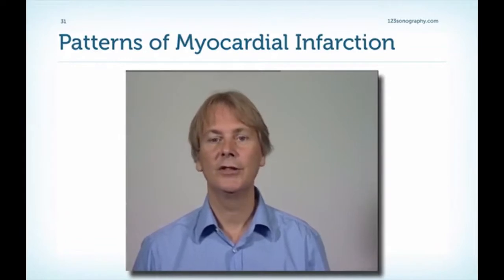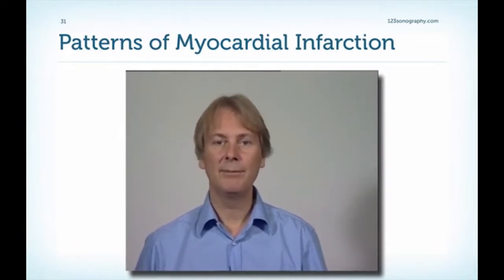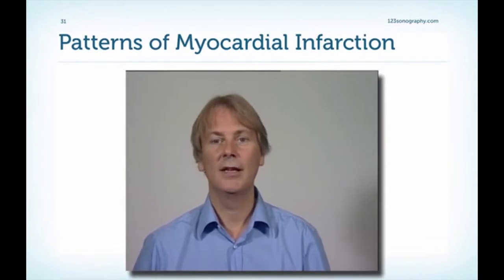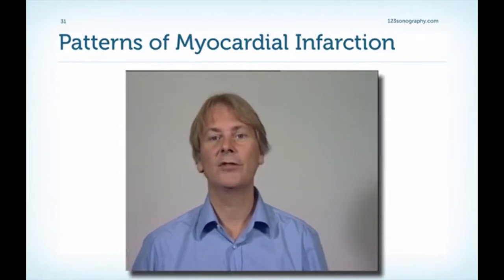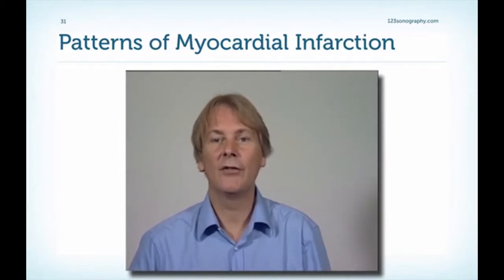So I'm sure you'll recognize these patterns in patients with infarcts. However, keep in mind that these patterns do not necessarily mean you cannot see other forms of involvement, simply because some patients have more than one infarct, an old infarct and a new infarct, for example. And, of course, contractility can change over time. For example, myocardium can recover after an infarct.